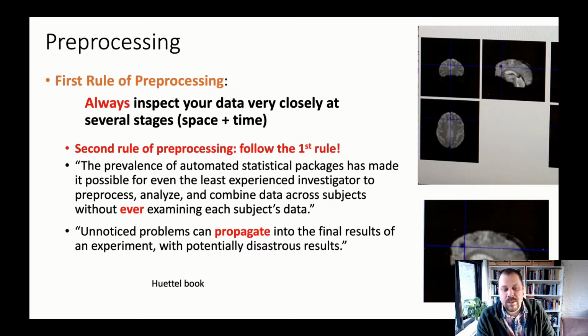So we will show you how to make a video for each participant that shows in very quick succession a timeline of how the scans were recorded. And you can see very large movements, you can see relatively small movements, and sometimes you see the eyes move, and sometimes you can even pick up some minor signal or actually quite large signal changes within the brain.